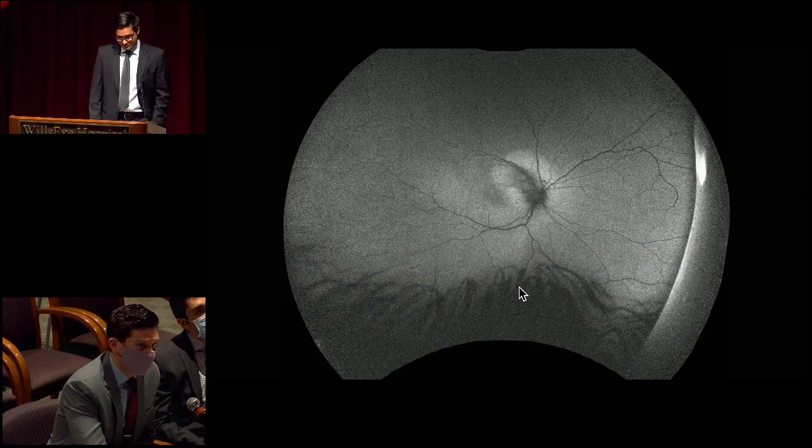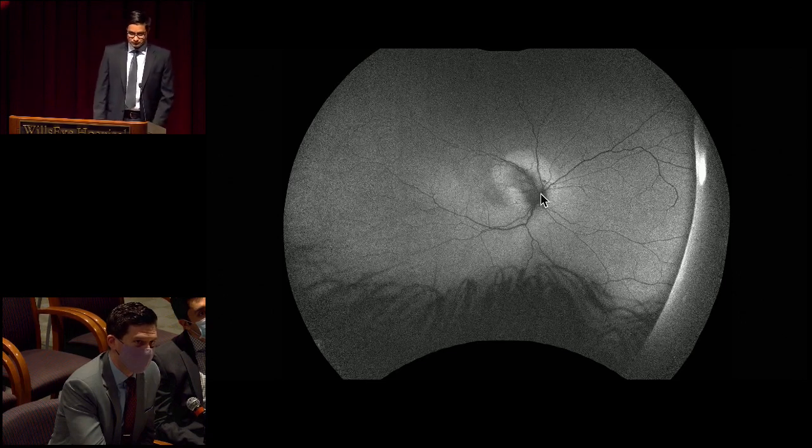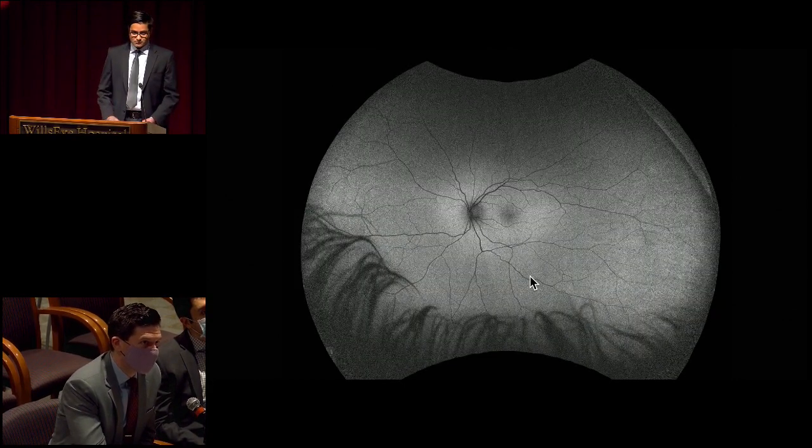And this is an autofluorescence of the right eye. Again, you can now see focused around this lesion around the proximal superior arcade. There's maybe a little bit of some attenuation of the fluorescent signal right adjacent to the vessels, but then a clear area of hyperfluorescent signal surrounding that. Again, you can see a little bit of this tortuosity of the vessels, again highlighted in the autofluorescent image. Otherwise, the peripheral autofluorescence pattern looks normal. And in the left eye here, this looks like a normal autofluorescence pattern.